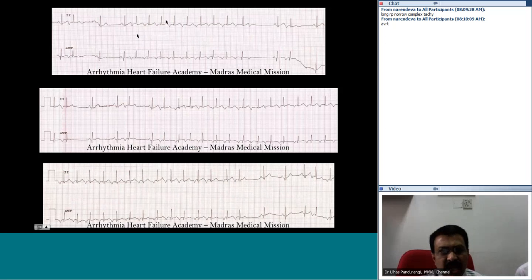There are hardly a few sinus beats, but these sinus beats actually fetch the diagnosis. And how is that? Look at this combination here of narrow QRS complexes occurring at a relatively rapid rate. What you notice here is a normal looking PQRS followed by the T which is abnormal. And consistently you would notice that it starts that way. That simply means this particular P wave is related with the previous QRS, and then that RP interval is longer and the tachycardia starts.